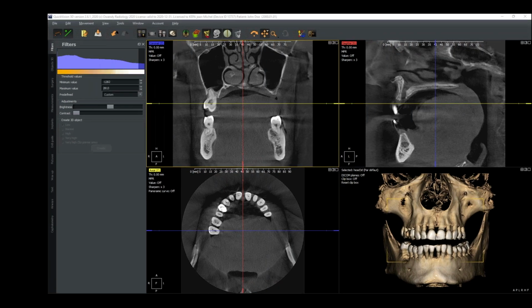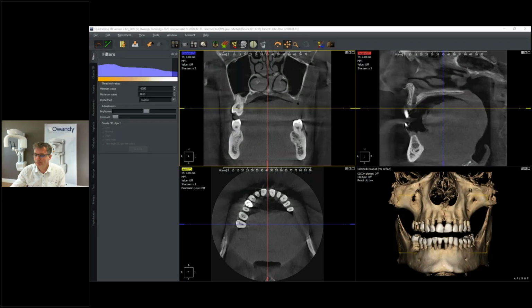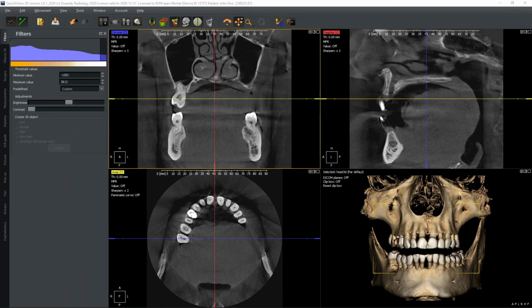I just go back with the camera. First step is to check the patient within 4 actions. 4 actions mean, okay, we'll check first this area here, and then that area here, and that area here. 4 actions. This is very fast. Each time you do a CBCT, I suggest to make a quick tour of the patient. Well, I go back for you to have the full screen.